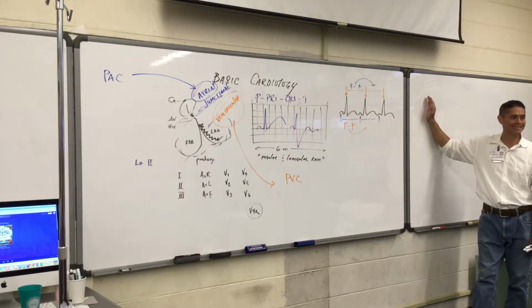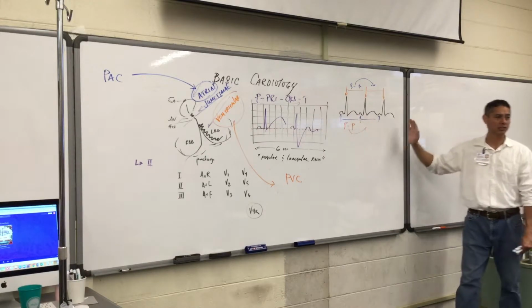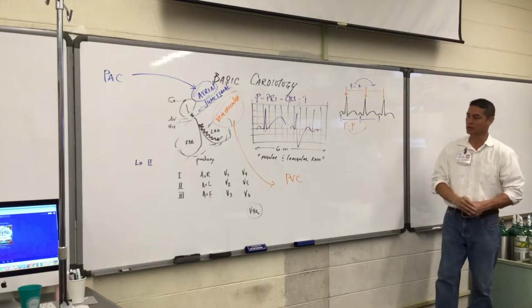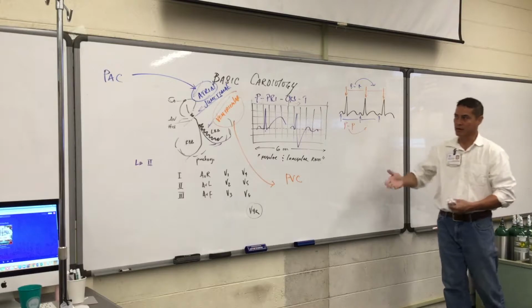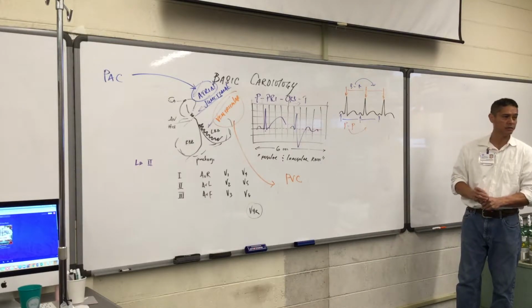Ventricular rate of 60. We also know then the atrial rate is also 60. That's important to know because the atria are emptying into the ventricles, allowing the ventricles to enlarge with a little extra stretch, so that when they compress and contract, we have more of a stroke volume that goes up in the ventricles.